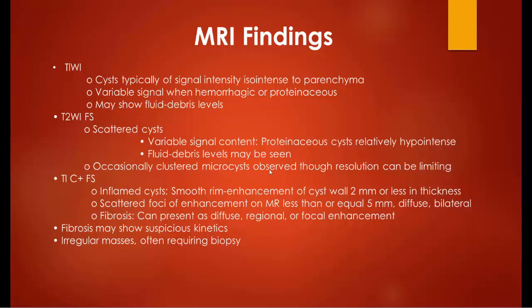Occasionally clustered microcysts observed though resolution can be limiting. T2 with fat suppression, fat saturation, scattered cyst present as a variable signal content.